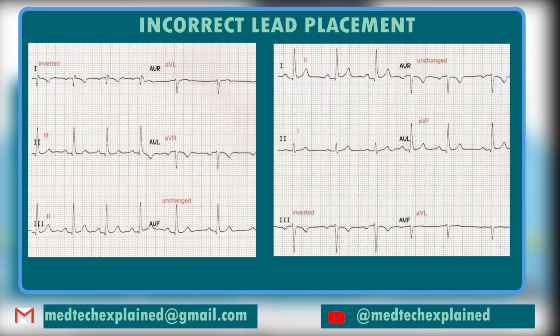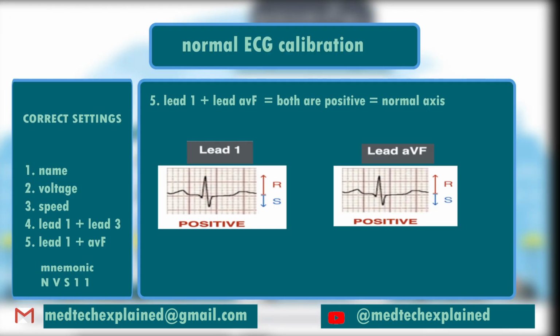However, even if the ECG done for a critical patient needs to be repeated, it is wise to look at the rest of the ECG while you wait for a new corrected ECG. This is because even a reversed ECG may still have other abnormalities that require your attention. Then after you get the recalibrated ECG, use the new one to confirm or deny the abnormalities in the previous uncalibrated paper.